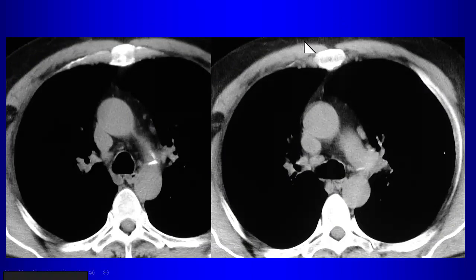Now, something else that's been noted, although I don't have a good explanation for it, is if you look at the descending thoracic aorta, you'll often find calcification along the wall of the descending thoracic aorta, right next to the insertion of this. Don't know why that occurs, but you'll notice there are patients that will have calcifications all over the aorta, but then you'll notice patients that have very little calcification, but they have calcification right there. Why does that occur? I don't know.